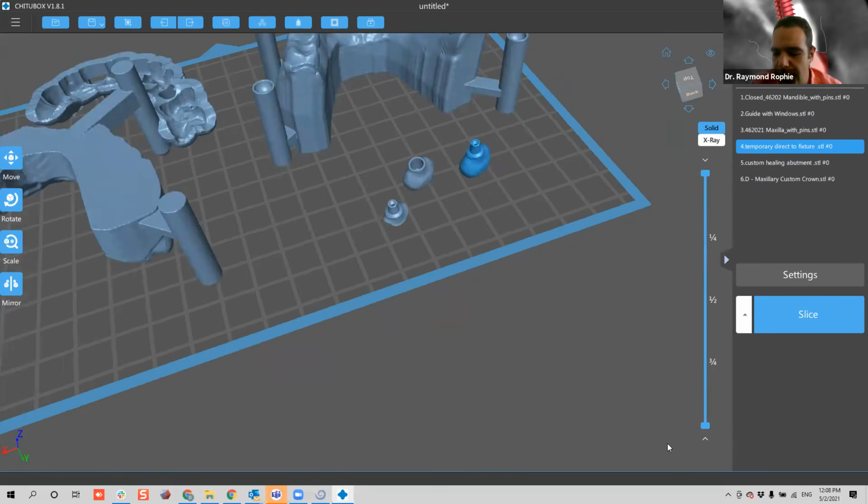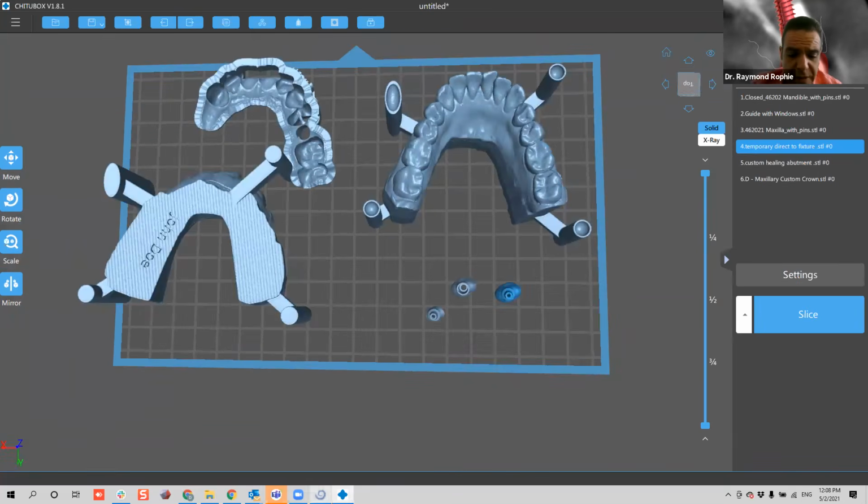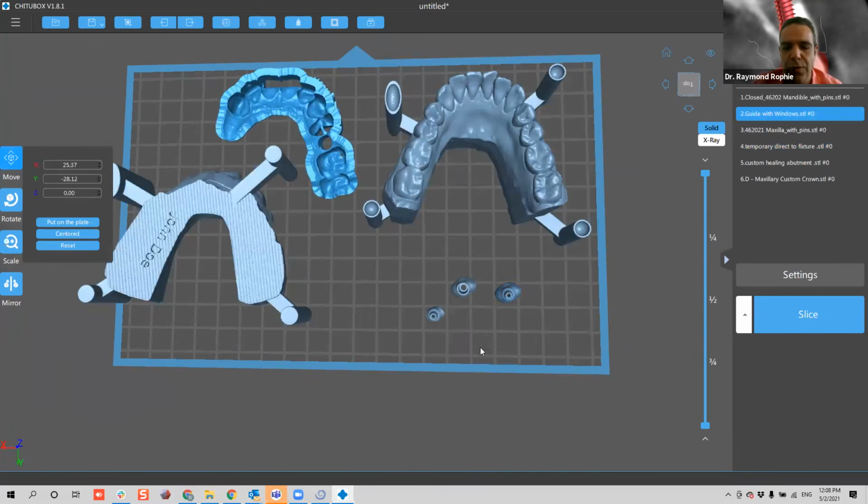And well, basically, that's everything that I wanted to show you. This is all that we did. We're doing the surgical guide, we're doing the models, we're doing the restorations. So let me now check if you have any other questions, I'll be happy to answer.